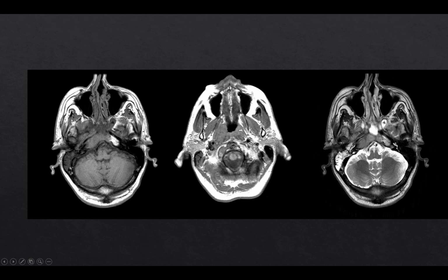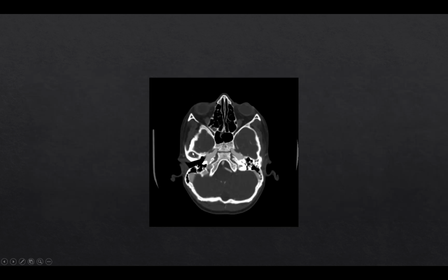Nasopharyngeal carcinoma can also have a very similar appearance. Notice there is obstruction on the right of the eustachian tube, which results in this right mastoid effusion. Another takeaway from this case is whenever you have a mastoid effusion, look at the nasopharynx for a mass. And here's a relatively uncommon but important entity to think about: ectasia or aneurysms of the carotid, which are coursing along the anterior aspect of the petrous apex.